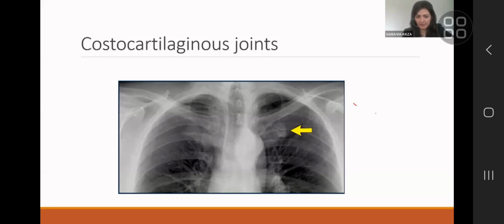So if this was an X-ray in an 18-year-old who came with rib pain or cough, you would discount it and call it normal, because 18-year-olds can have prominent costochondral junction joints, extra joints like that. If this was a 45-year-old chain smoker who came with hemoptysis and weight loss, and you looked at that, and you couldn't see that lucency of the joint through it, you think, is it worth taking the risk? Should I just get a CT? And that's completely acceptable as well.